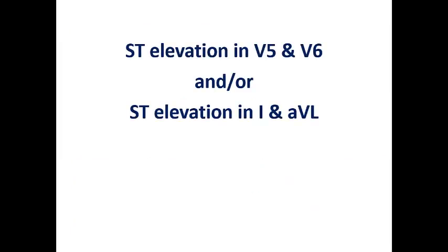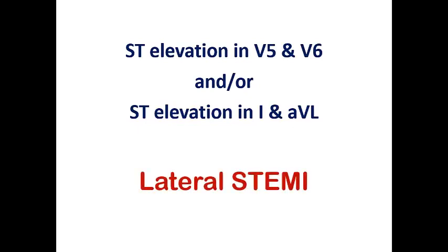ST elevation, of course, in V5, V6, and in 1 and AVL, whether the 4 leads are involved or just 2 of them, is called lateral STEMI if it is isolated. And so lateral STEMI, although it is less common than anterolateral, for example, is of course not uncommon to see in your practice: ST elevation involving the lateral ECG leads alone without other additional leads.